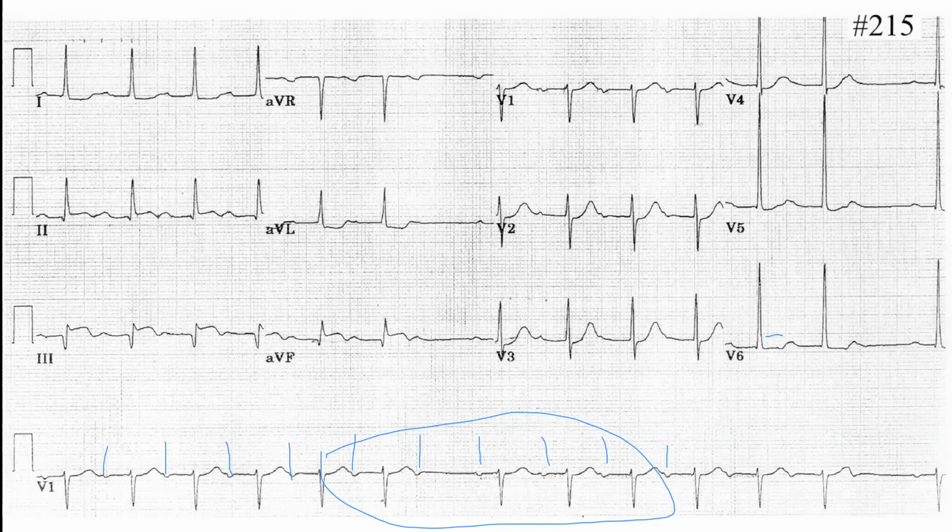They look about the same, the last and the first, or actually the last looks longer than the first. Yes, that's longer than the first one. That's Mobitz type 1. Very good. Okay, go on. And then to me, the QRS looks a bit narrow. Narrow, yeah, okay. All right, next one.